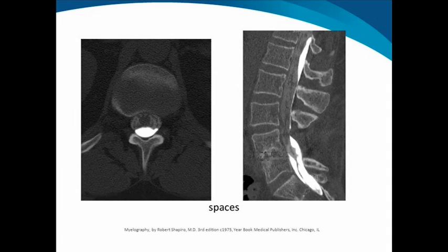If you scan this patient approximately 3 hours later, the subdural space will return to near normal, and the dye will move slowly into the subarachnoid space. Not ideal for image quality. Clinically, not so relevant. The underlying reason for why this may have occurred is that the puncture was performed at the level of a laminectomy. Oftentimes the dura is slightly altered from its normal state after surgery. The layers are slightly less adherent to one another, and they can therefore separate out.